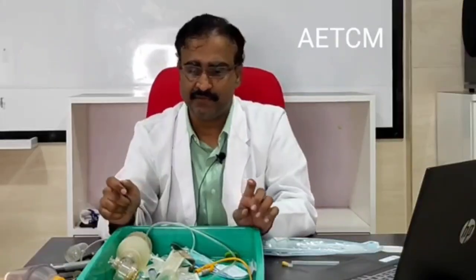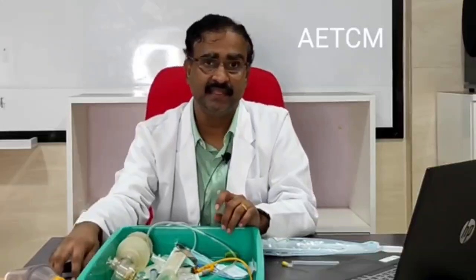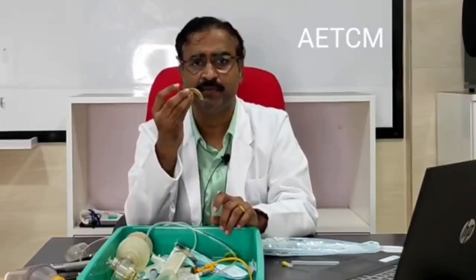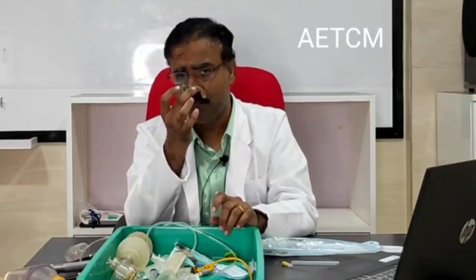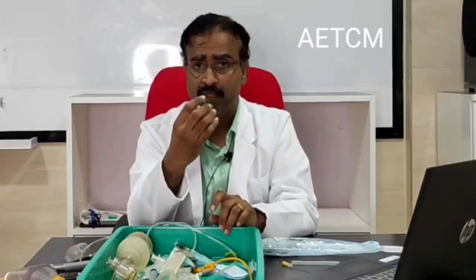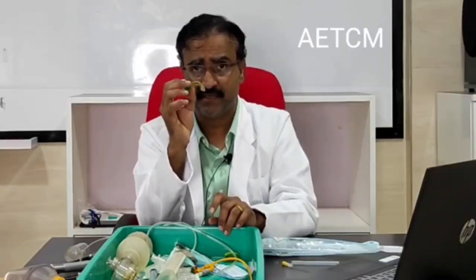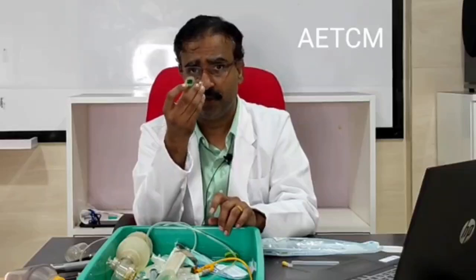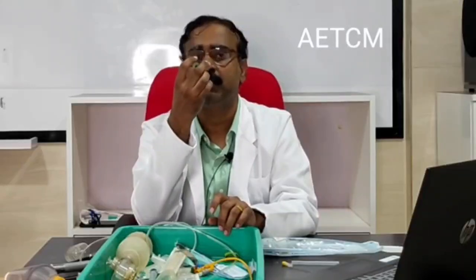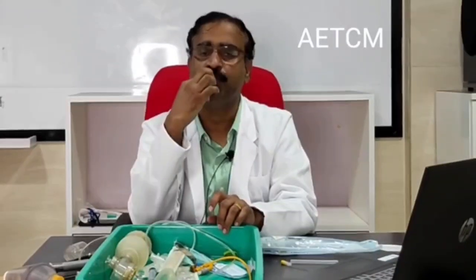The next instrument that I would like to talk about is the oropharyngeal airway. Now this belongs to a small baby, so it looks small. The oropharyngeal airway, as the name suggests, is to be inserted in the mouth and it goes right down up to the pharynx. If this is to be inserted in a baby, you need to keep it the opposite way, this way. Insert it upwards. As soon as you nearly touch the upper palate, you turn it clockwise or anti-clockwise and allow it to go in fully. So where can you use this?